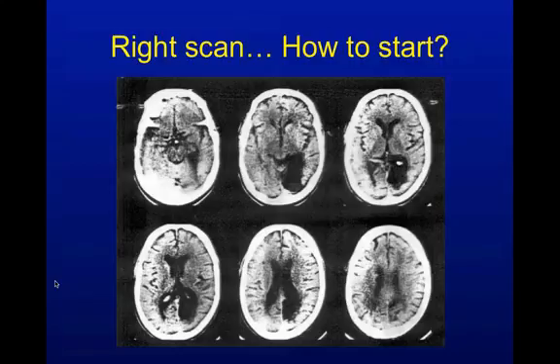Or gunshot wound to the head. Okay, so you got the right scan, and you got it turned all correctly. Now how do you start? Right? So much stuff to look at in so many in the series. It's not just a single chest X-ray done. You got to do all that.